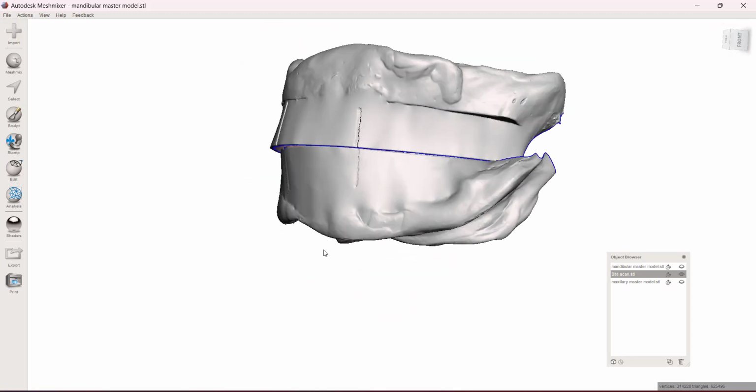And I'm going to do this in two parts. So this is going to be actually using Exocad's denture module, which I'll be real honest, I just now learned that I actually have access to. I wasn't aware I had that module, but I've been for the longest making dentures just using the basic Crown and Bridge Exocad module too. So I'll show you that. There's for sure pros and cons to both of them. And so anyway, we'll go through those.